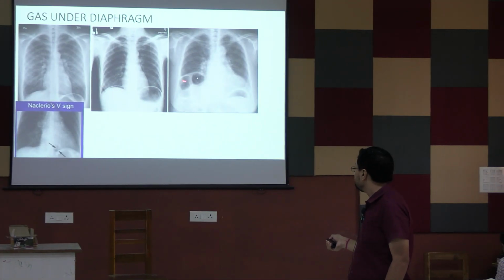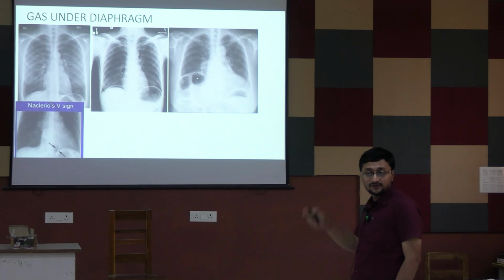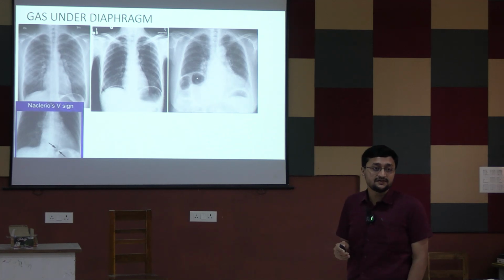But this is not free gas. This is colon, this is colon shadow. These are the haustrations. So this is called Chilaiditi syndrome.